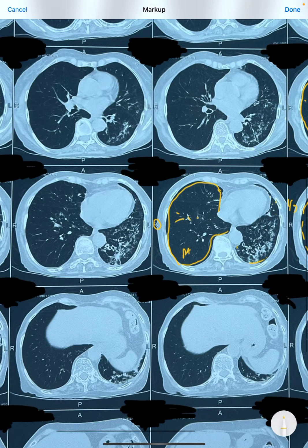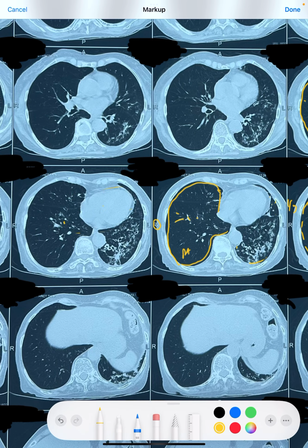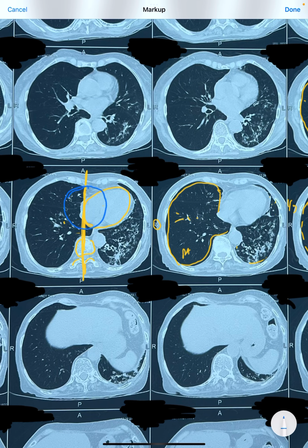I told earlier also, this is the mediastinal structure. This heart is in the anterior mediastinum and it should have been in the center. In the center, how? Whenever we divide this into the middle, the heart should actually be in the midline. Just see, this is the vertebra, this is the vertebral spine, so this is the midline. This heart, which has to be in the center, should have been ideally like this. This was its ideal location, almost half on the left and half on the right.